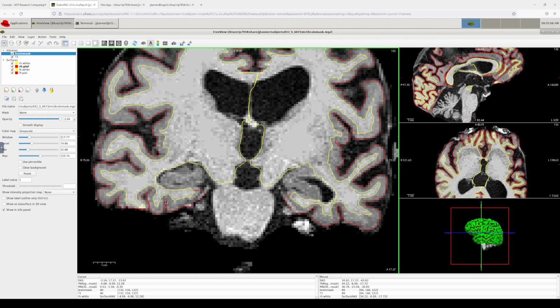That's an area that we call the entorhinal cortex. It's a primary input to the hippocampus, a lot of input. It's very important for memory. It's an area that shrinks in Alzheimer's disease and to some extent in Parkinson's disease, and other neurodegenerative processes will affect that part of the brain.